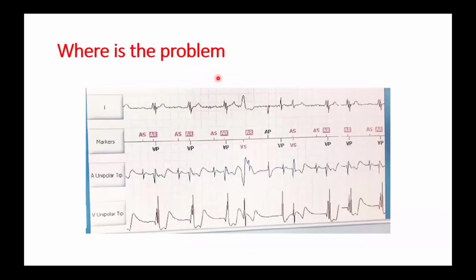Here you have to use what the pacemaker sees, and you have to look at the marker channel. This is most probably St. Jude or Medtronic? St. Jude. This is actually St. Jude. So if we look, the first beat is atrial electrogram, and then ventricular electrogram, paced rhythm, and is sensed in the atrial chamber. But because it is in the refractory period, it is atrial sensing in the refractory period. This is the far field ventricle sensed in the atrial chamber and is marked as refractory.